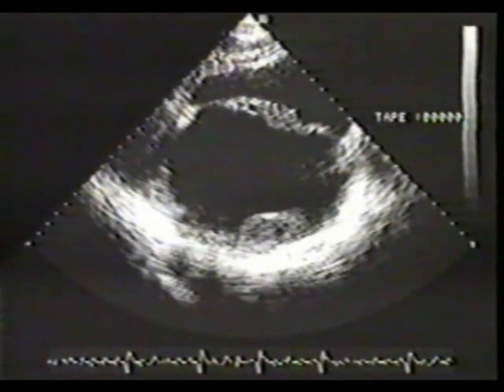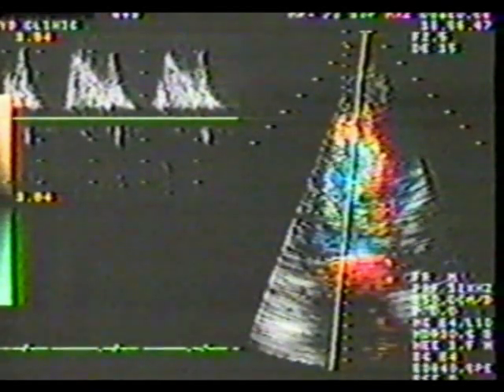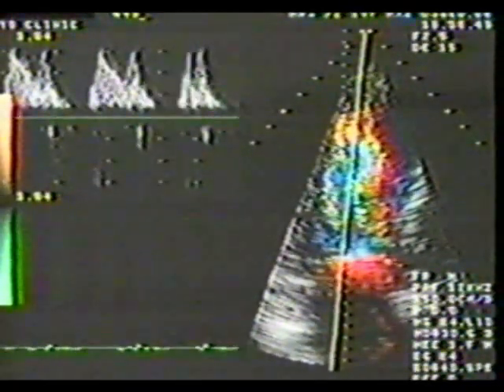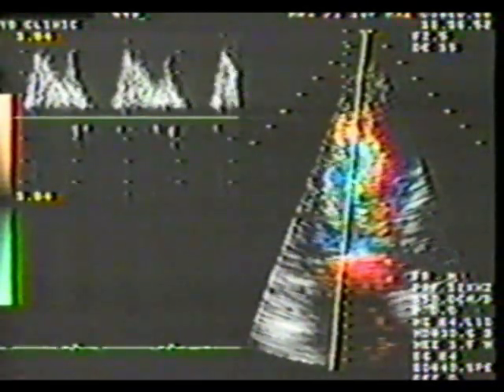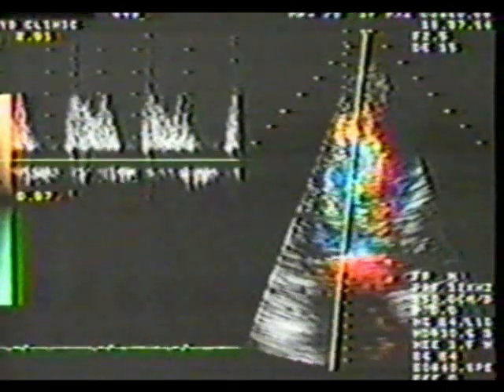While standard external 2D echocardiographic examination is useful for detecting thrombus in the body of the left atrium, atrial appendage thrombi are best detected by transesophageal echocardiography. Combining continuous wave and color flow Doppler allows us to most confidently calculate the hemodynamic disturbance resulting from mitral stenosis. This hemodynamic information, coupled with the structural detail from the 2D exam, allows us complete, non-invasive assessment of patients with mitral stenosis.